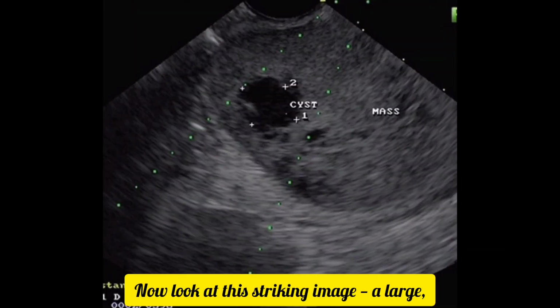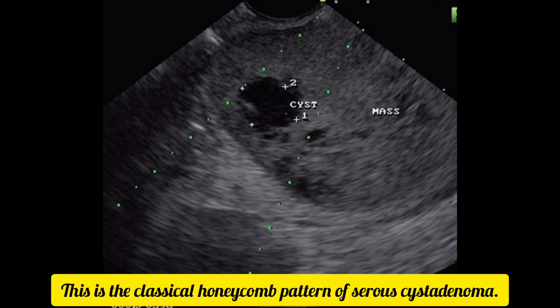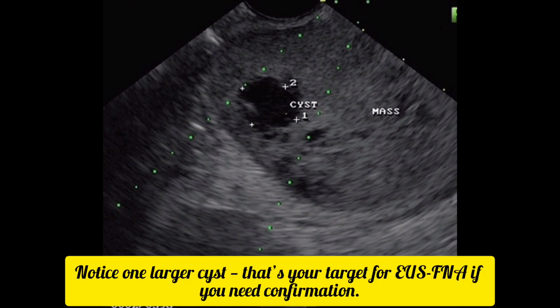Now look at this striking image, a large, well-circumscribed mass in the pancreatic head with multiple tiny cystic spaces. This is the classical honeycomb pattern of serous cystadenoma. It's benign. Notice one larger cyst. That's your target for EUS-FNA if you need confirmation.